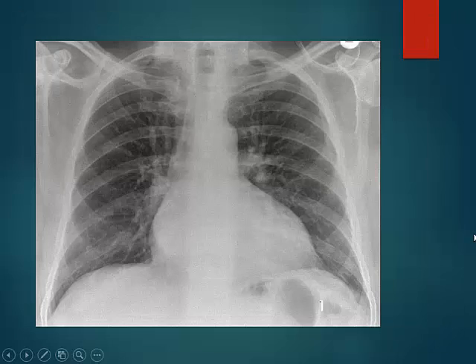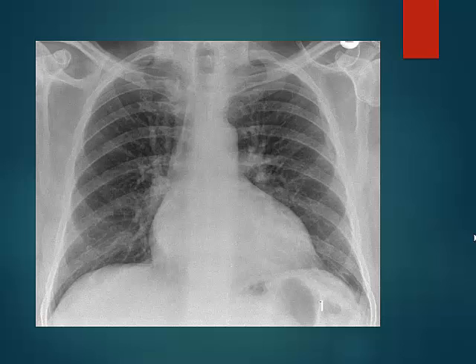Now coming to a very common X-ray presenting in adult cardiology clinics, this one here. So if you want to go through the findings here, let's start with heart size. What do you think about the heart size here? Is it normal or is it large? It's large, okay? So everybody agrees with that.